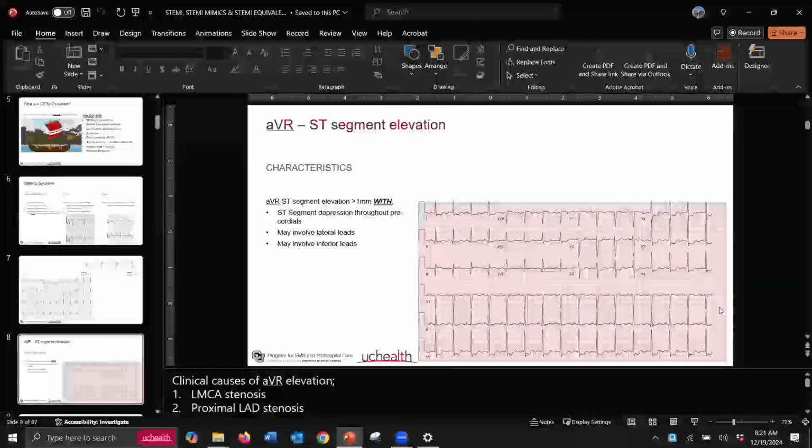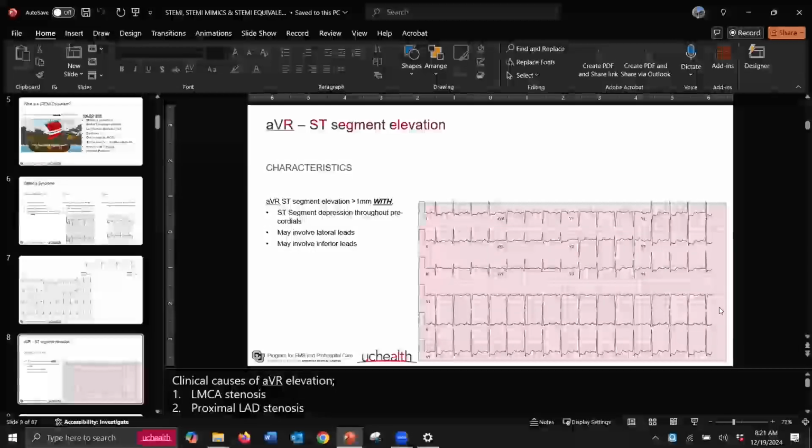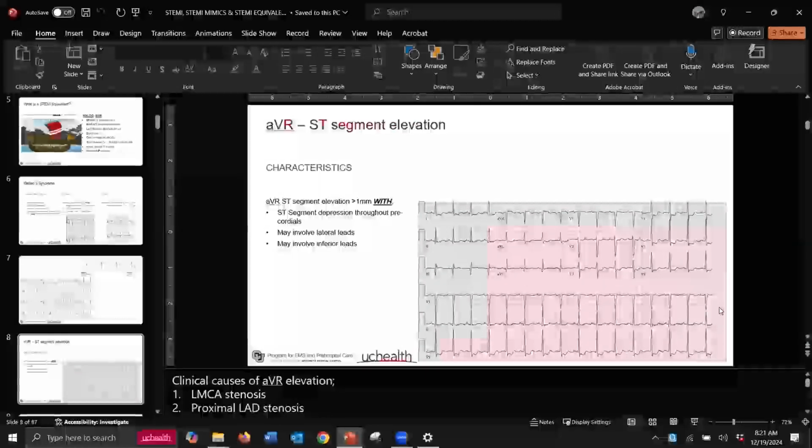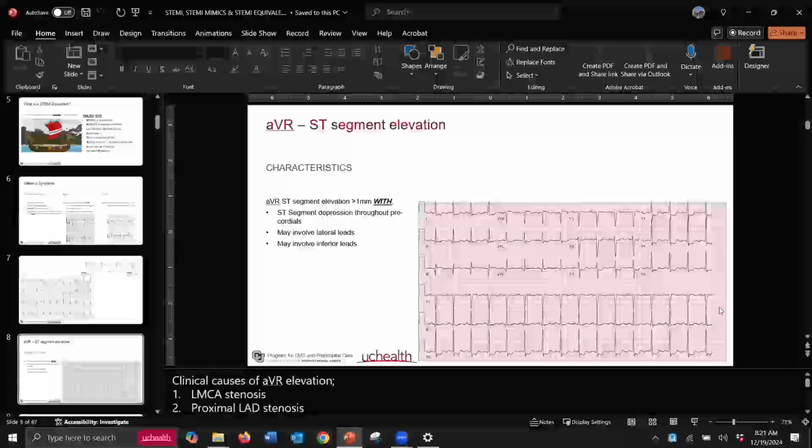What do you think this patient's doing here? If you look at this EKG, we have a rate of greater than 100, right? Why are they tachycardic? Because they're compensating for a low flow state in the coronary arteries and lack of oxygen. And now they're getting some hypokinesis, some lack of contraction of the left ventricle, altering cardiac output. And so what is our compensatory mechanism? Increase our heart rate so that we can get more oxygen to A, the coronary vasculature, and B, systemically.